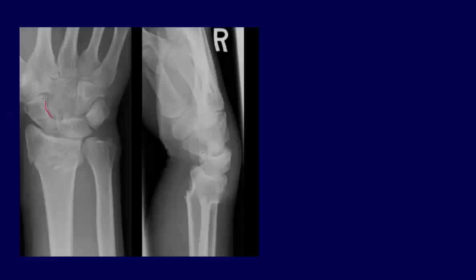Okay, so here we have another fracture. We will begin analyzing this fracture by tracing the cortical outline of each of the carpal bones. So far we are not seeing any fractures. We'll go down to look at our ulna. And as we get to our radius, we can see that there is in fact a fracture. I will find this on the right hand side of the screen.